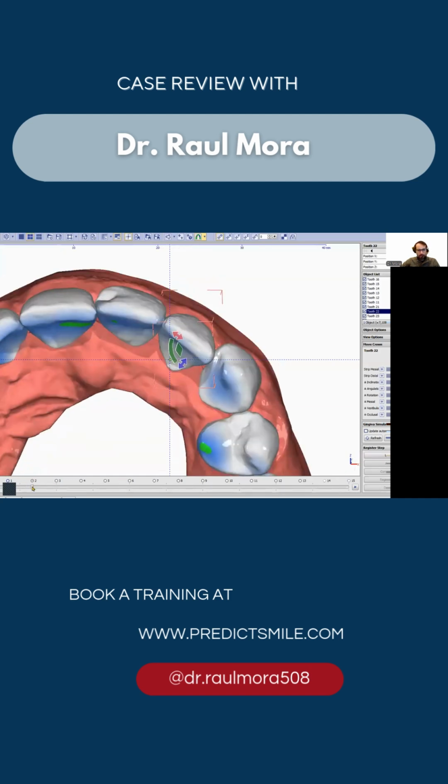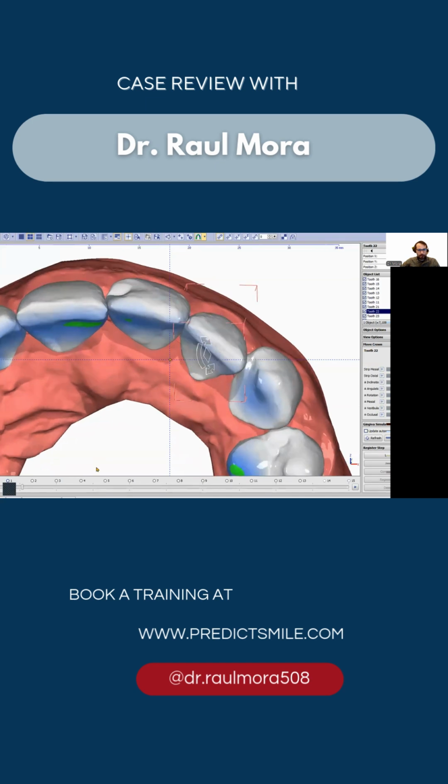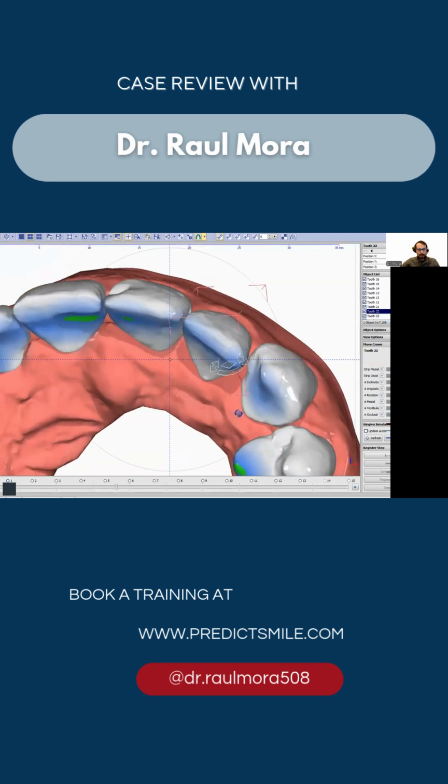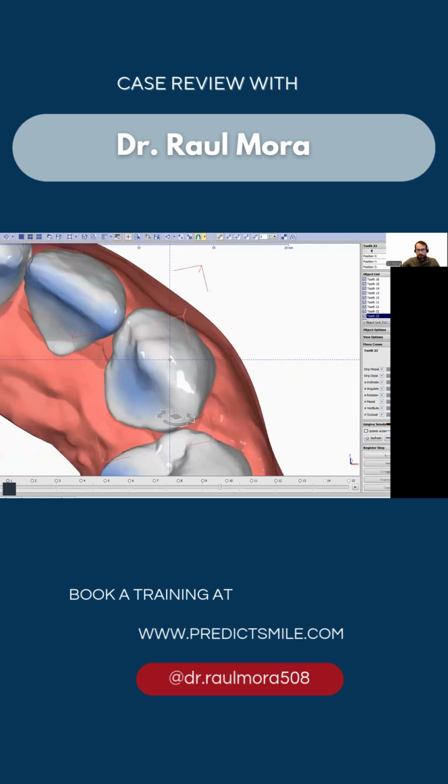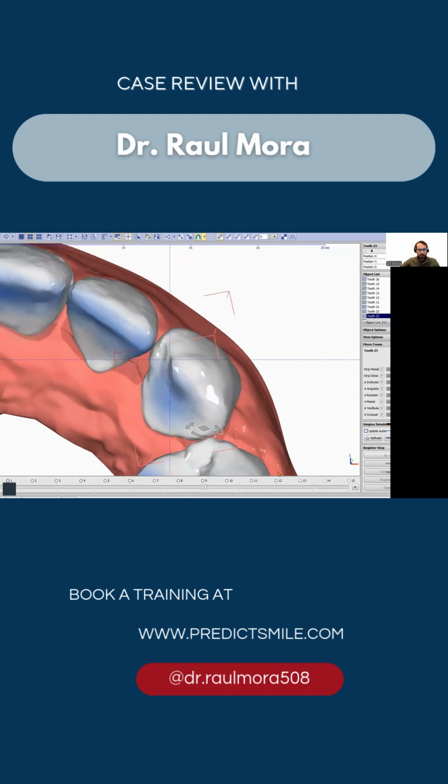So let's see now what we have. Let's delay the movement of the lateral incisor. We have some space created here. So now you see everything goes smoothly. Space everywhere, space everywhere. This is what you should do. Now this tooth is coming back, and we may start having some collisions, but what are we going to do? Let's just delay the retraction of the canine a couple of steps, and that's it. And let's make the movements of the lateral a bit faster so we don't have a huge treatment plan. So now let's check what we have here. And you see how nice everything flows.